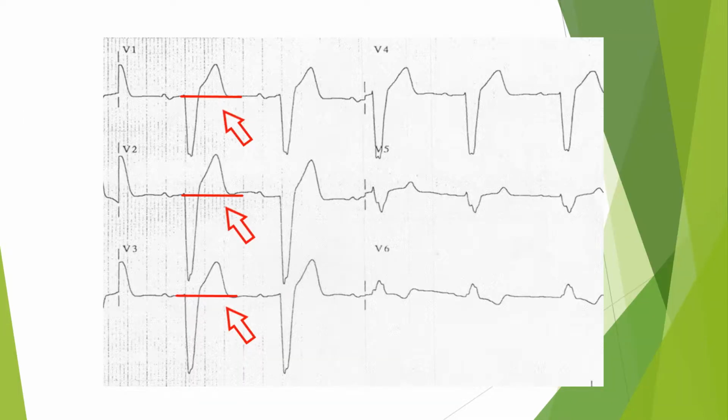You can see here, I've marked again, we have what might appear to be clinically significant ST elevation in V1, V2, and V3, though it's not actually clinically significant. This patient is not having an MI. This is a normal left bundle, albeit a pretty ugly left bundle. This is a normal left bundle, and the ST elevation is normal.